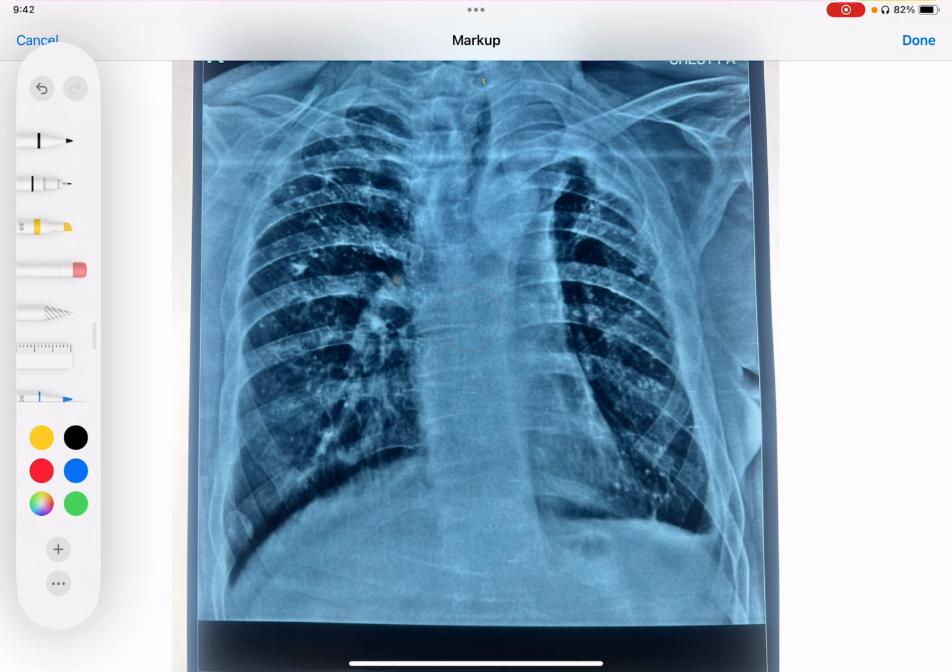If you can see the upper area of both sides of the lungs, then we can see this. There is a very nice dome of the lung which we can see on the right side. But in here, this dome is not at all there. In fact, this much area has a radio-opaque structure which is basically displacing the lung. So the lung is, in short, starting from this area, which should have been from here. So there is a soft tissue structure which is basically replacing the lung here.